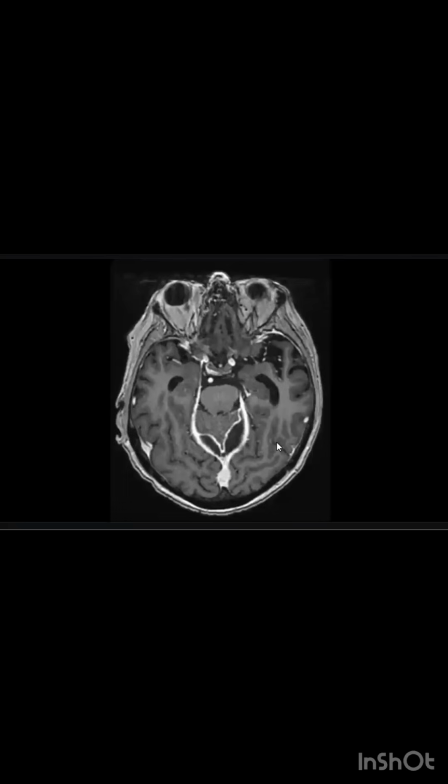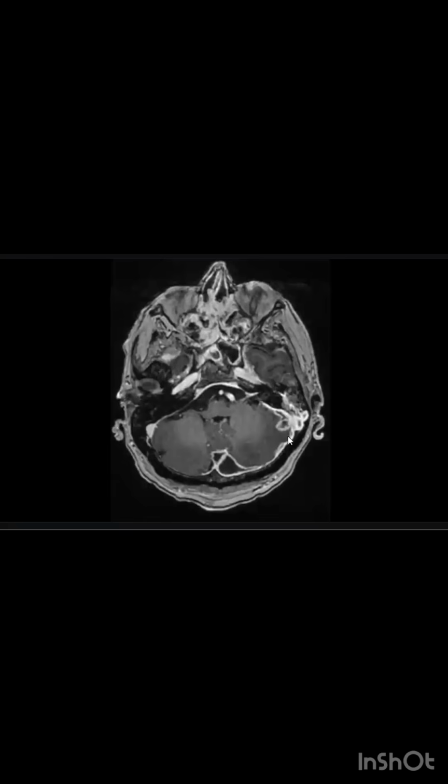Yes, there is something here in the ventricle. Yes, there are restricted areas in all the region. So it is an emergent case. They have to go for drainage. There is also suspicion of thrombosis. Yes, venous sinus thrombosis.